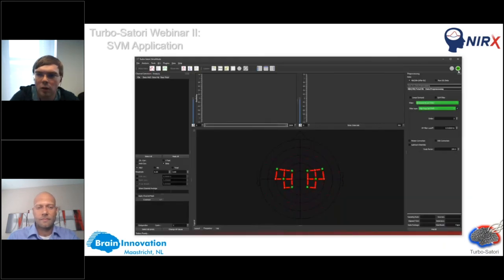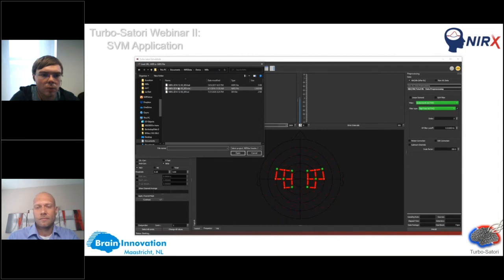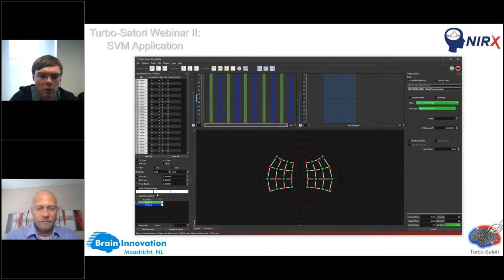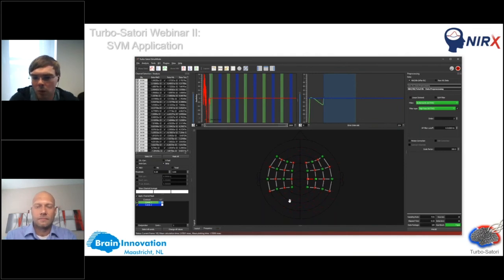The computations that you see here, especially the t-test, is quite extensive because it's running in the background a full autocorrelation correction. So this is a full GLM that is done for the t-test. So this can be quite extensive for the computation. But if you don't need the t-value in real time or online, then you can just switch to beta, and the computations will be much faster. And so if you have this, you can just perform it, and it shouldn't be a problem. But the most important is that you check in advance using your setup if this is possible or if this is a problem. Okay, thank you.